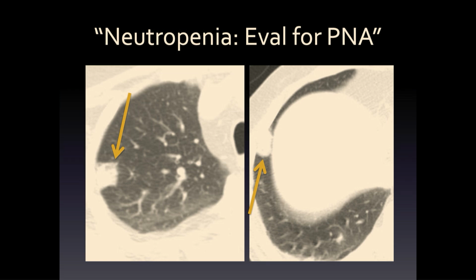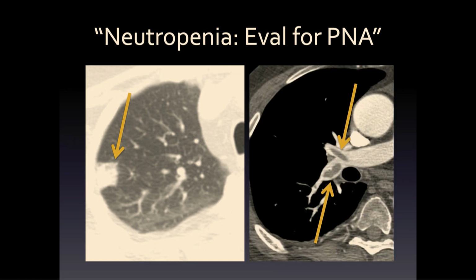Why am I being so wishy-washy here? I think there's almost always a differential when we're debating this, infarcts. So here's a patient where they had neutropenia. They had signs of infection. They were totally sure they had infection. We had multiple opacities. What should that be? That should be infection. What was it? A random PE and infarcts on top of it. So this differential tripped us up.